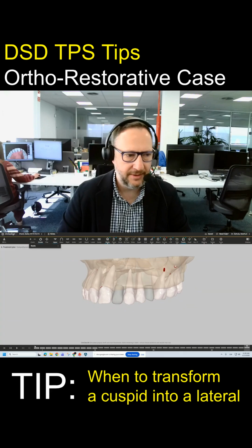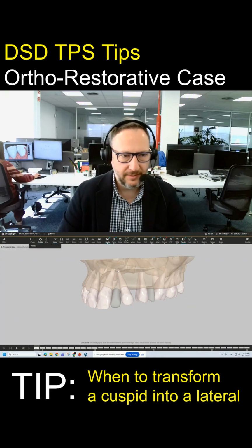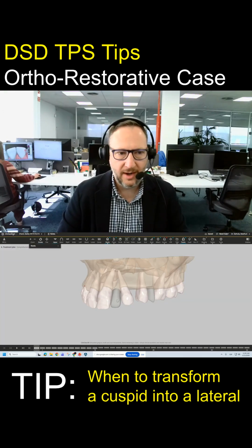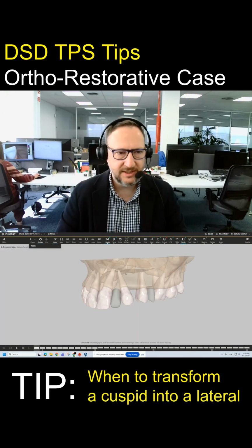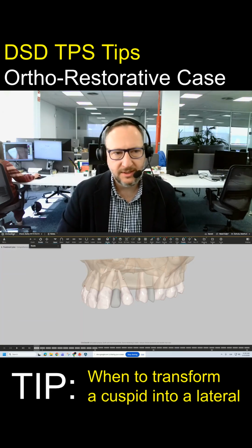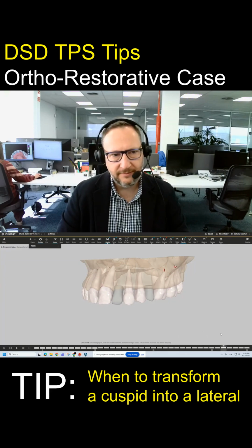Let's focus in this area and let's check the amount of root movement we need to do, because actually we don't have any space to place the implant there clinically. And looking just at the crown area, it seems that we have, but when we bring the CBCT, we see that the root is completely tipped to mesial, filling all the space that we need to place the implant. And to do this movement, to distalize, it's a very complex movement that takes a lot of time, and probably we won't achieve all of this tipping in the first set.